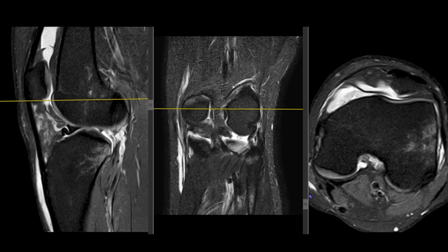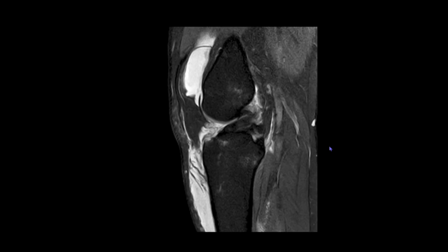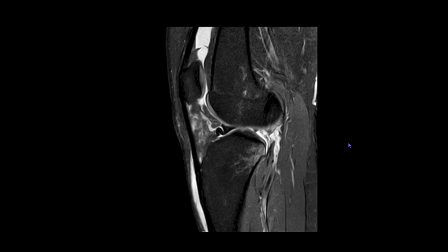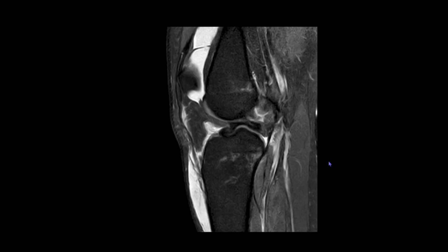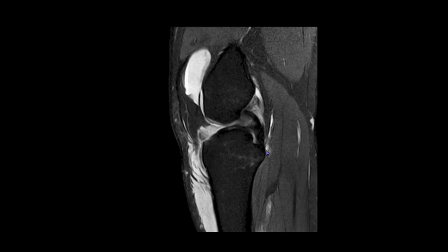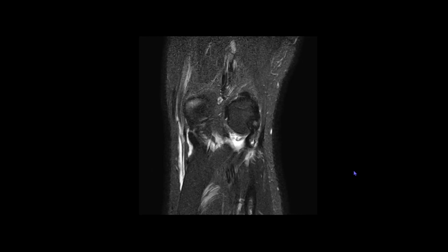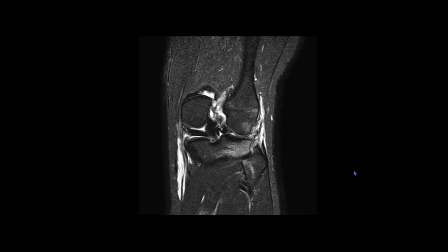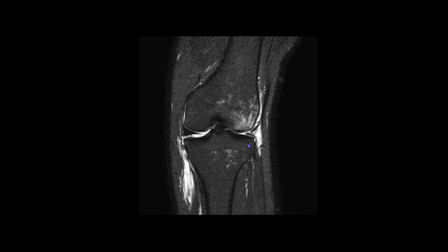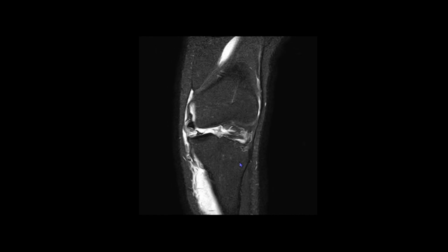So all in all, what we make the note of is the full thickness tear of the anterior cruciate ligament. Then there is a bucket handle tear of the lateral meniscus. Then there also is a high grade partial avulsion of the anterior root of the medial meniscus, along with which we have got moderate knee joint effusion. Then there is avulsion of the medial collateral ligament from the tibial attachment, and it appears to have flipped and crumpled up and is seen insinuating within the joint space.